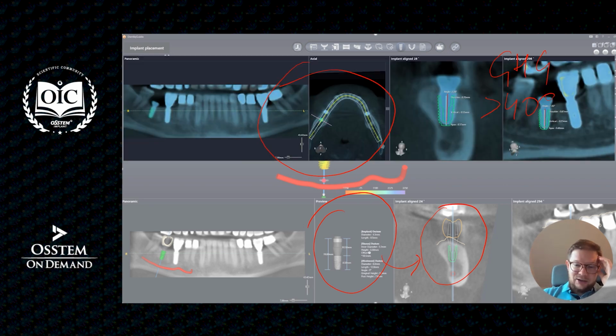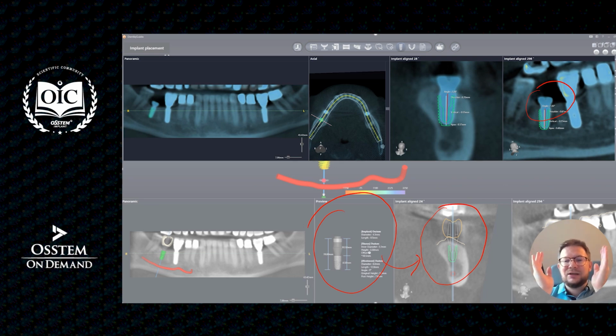And if we take later the post-operative CBCT, we can check the accuracy, and here you have the 5 on 5 healing abutment applied on that implant, which could be then replaced by the abutment of the gingival height 4 at least, and angulation which is narrow, and it will create a good environment for the tissue of supraimplant complex.